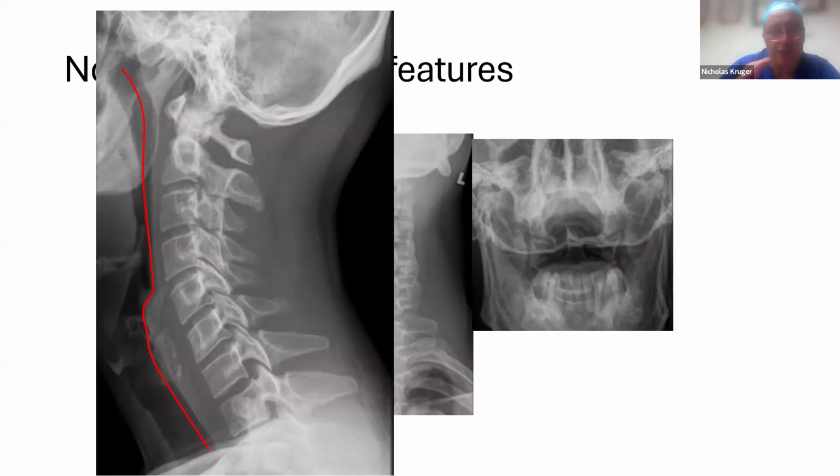When you start at X-ray, the first thing you go for is your soft tissue line. Then the next one is the anterior body line, and you've got to have nice, smooth arcs with no step in the line. That's your posterior body line too. These two lines are very easy. Don't forget them, just go through them. Look how the posterior body line goes up to the back of the peg. It's almost a straight line; the back of C2 and the peg is one continuous line. The anterior body line goes to the front of the peg.